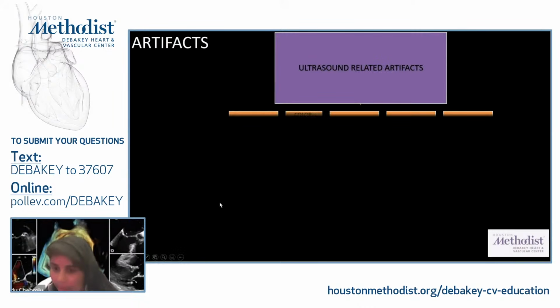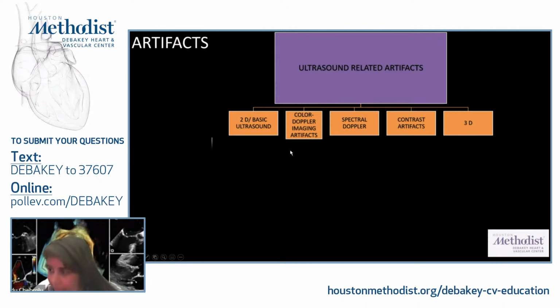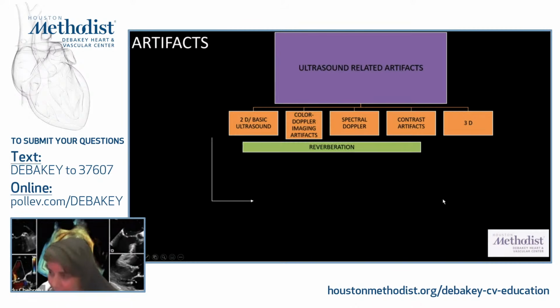We're going to talk briefly about 2D or basic ultrasound artifacts, a little bit about color and spectral Doppler artifacts. Contrast artifacts, I think Dr. Zogby has elaborated beautifully in his contrast talk. And we'll also talk a little bit about 3D artifacts today.